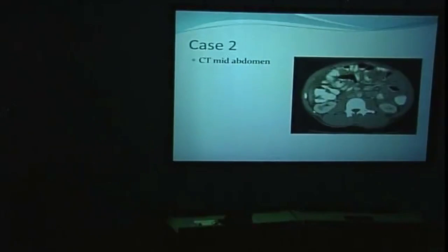But also, when you come lower down in the abdomen, again we see this thickening of the peritoneum, abnormal density. This should be fat density in the omentum here, and also in the mesentery. It should be dark, like the subcutaneous fat here. This is increased density and nodularity. This again is diffuse peritoneal TB.